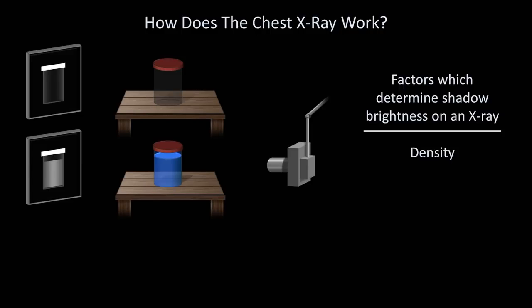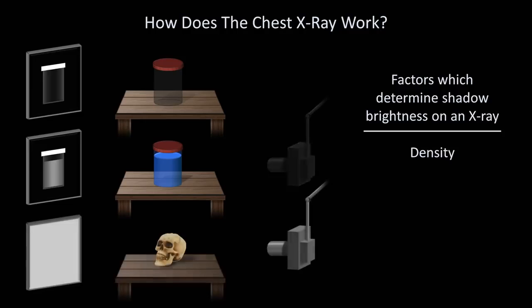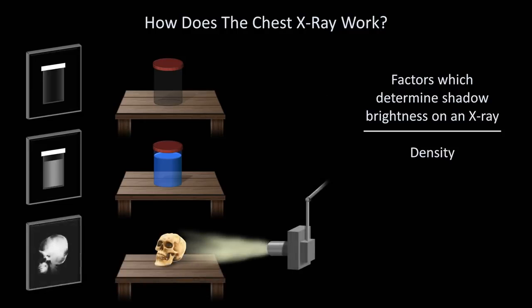And now for a more interesting test subject, what happens when X-rays strike a skull? You can see that the resulting image is lighter than the jar of water, but not pure white like the image formed from the jar's metal cap.